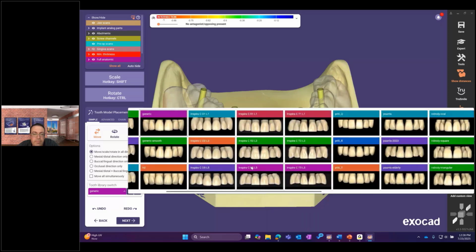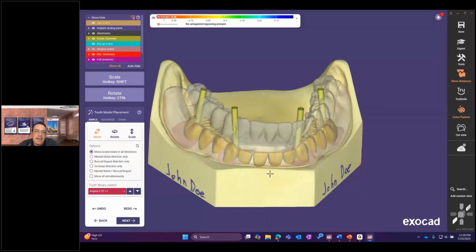Yeah, and those additional cutback libraries that are available with Inspira, I'm sure a lot of people are going to be very happy about that. So yeah, right. Before, there were only a couple libraries that had the cutbacks for thimble bridges, but now all of those have it, so they have a lot more options there.